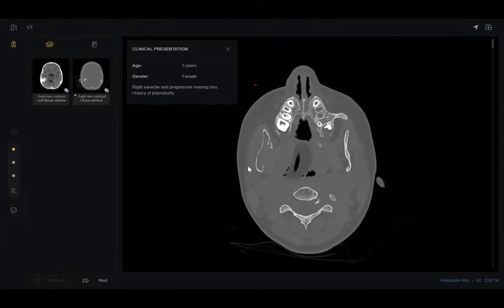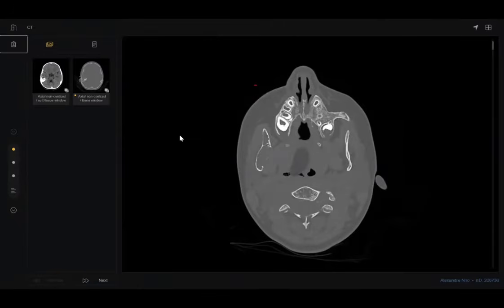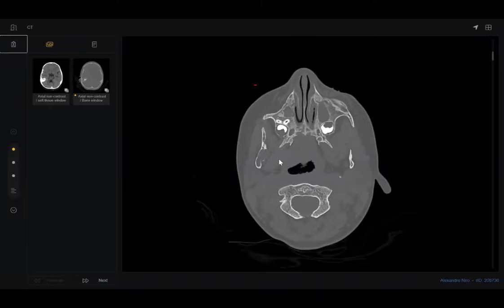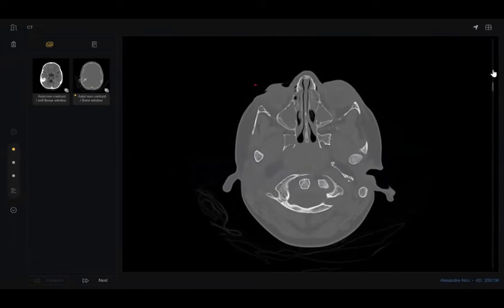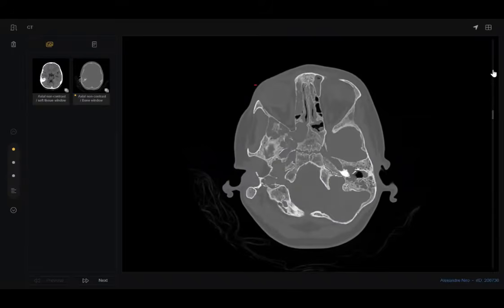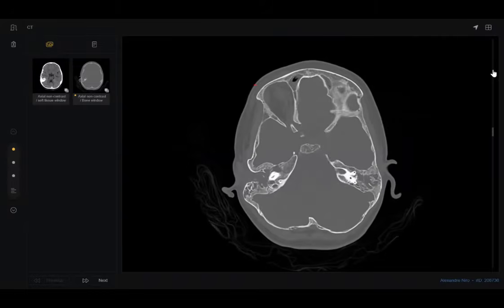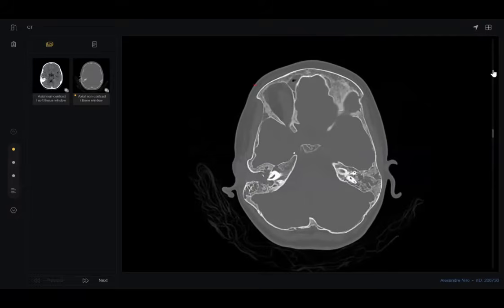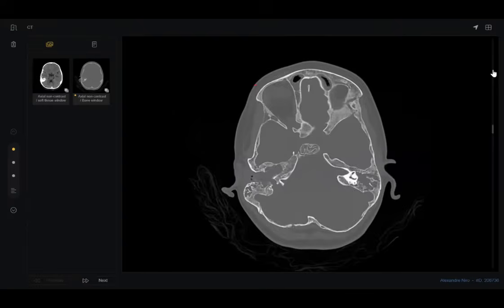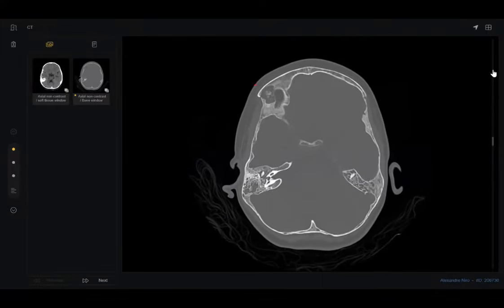Okay, sir, just give me a second. I think the right mandible is also expanded. I would like to see that also. Yes, the right hemimandible is also expanded. Yes, the right petrous apex is also expanded and it appeared thickened. Other abnormality like osteomyelitis can be there, but there is no bone destruction, so it appears less likely.